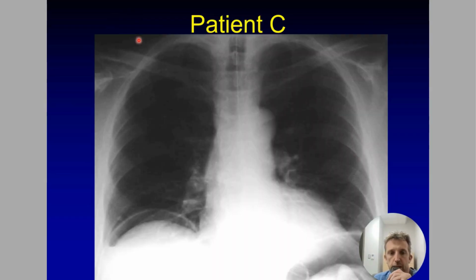Okay, how about this patient? Stones, bones, mass, and gas. They have an enteric tube. It's going in the stomach. That's good. Bones look okay. No mass or mass effect. How about bowel gas? Is there free air? Well, this is actually a chest radiograph for the upright portion of the acute abdomen series, and there's air under the right hemidiaphragm. This is free air. Air is rising. That's where we want to look if the patient is standing.